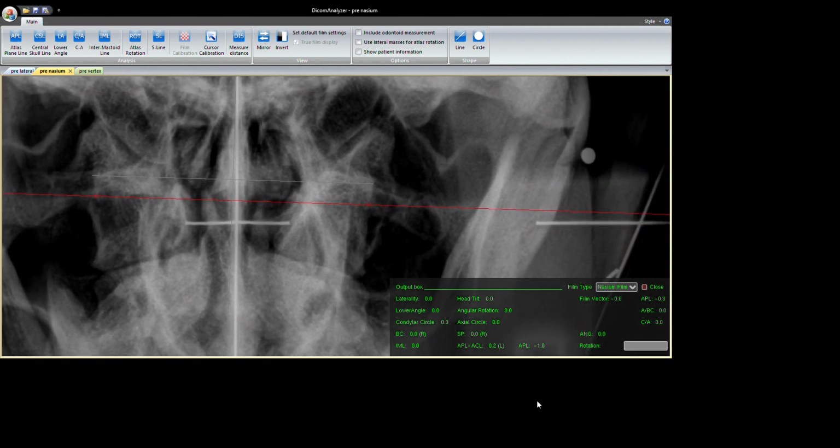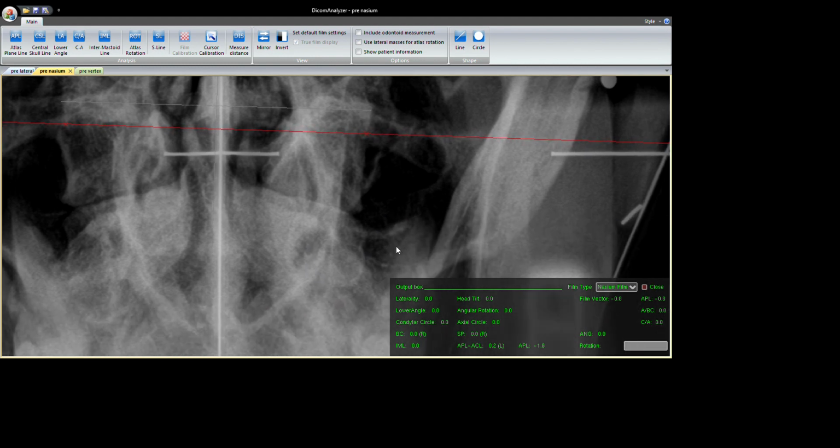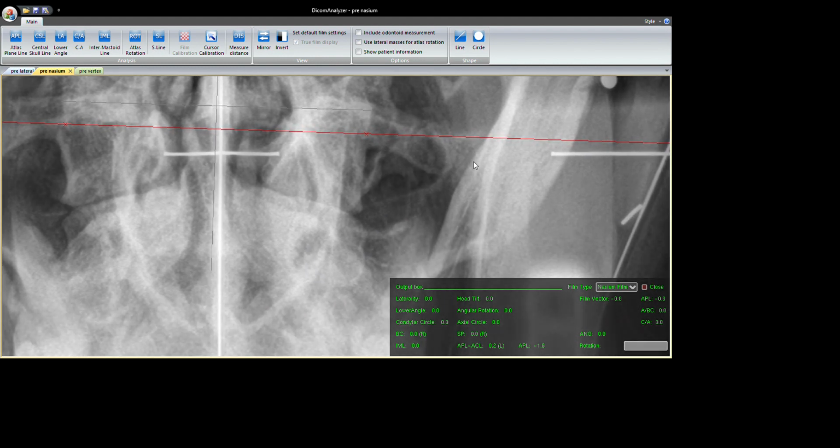Within most softwares, if you use other softwares, the function will show as green if you're within a half degree, and by NUCCA protocols, that's pretty close to where you should be, unless, of course, the Atlas arch is different from one side to the other, which can happen. But this is an indicator you can check.